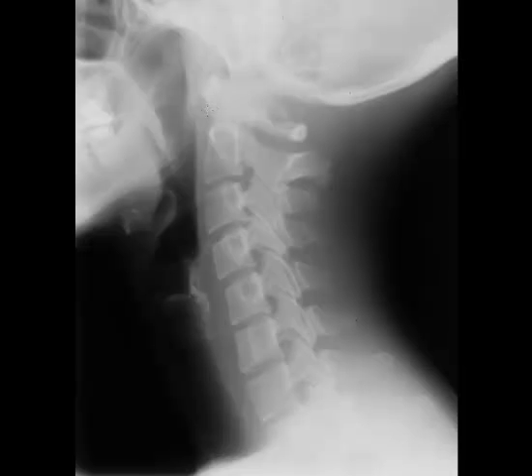On the lateral cervical neutral, the anterior arch of atlas is visualized in this location. I'm going to make my pen size a little bit smaller because that line is a little too big for what we need here. Now the posterior arch is visualized here. Now for some of you more experienced viewers, you'll notice that this patient has this density here. It's just calcification of the atlanto-occipital membrane in the region of the arcuate ligament. There's some debate about whether it's truly an incidental finding or not, but for our purposes, we'll just point it out.